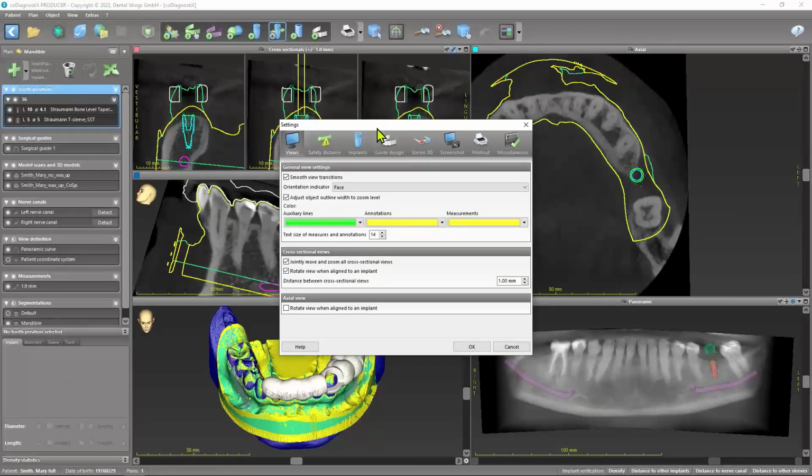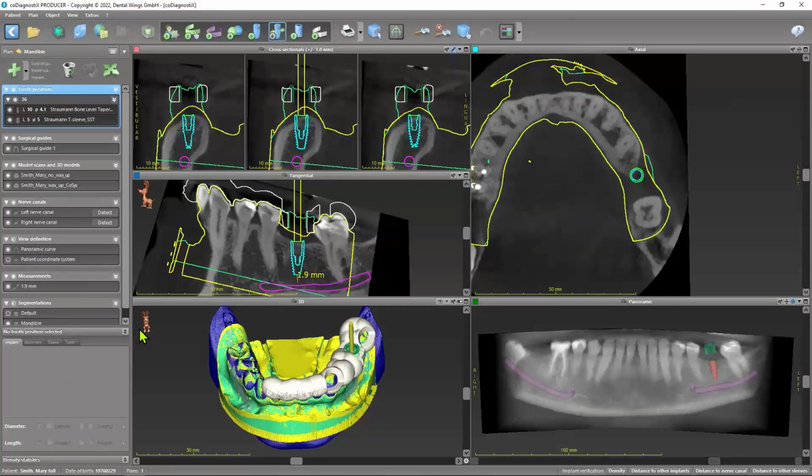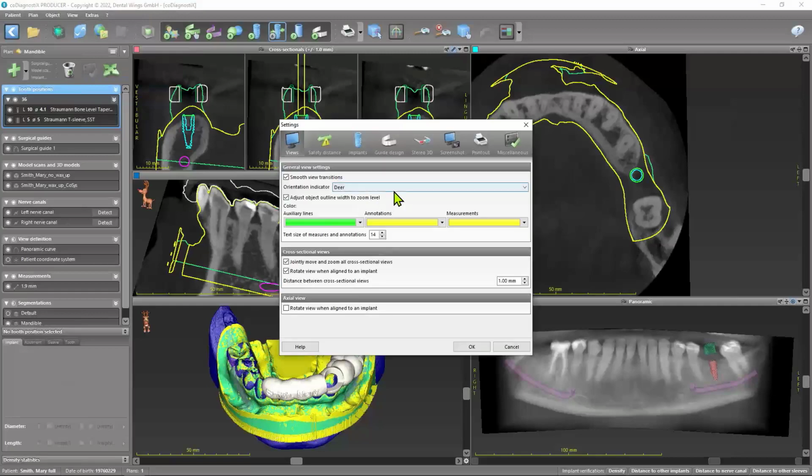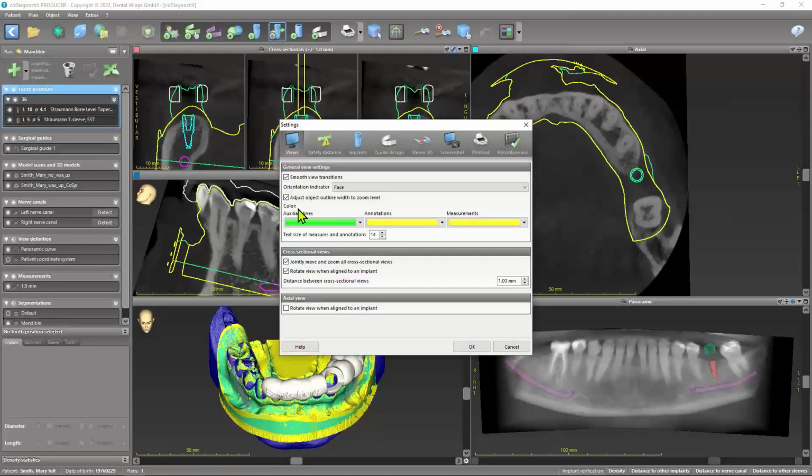And for example, if you see, I have my orientation marker here. This is the face, but if you click on it, you can change it. Especially now around Christmas, a lot of people change it to Rudy. So you have the deer really with a red nose. You have a closer look. Yes, this is made for this. It's certainly not necessary, but it's a little bit fun in the background. So I change it back to the face. And okay.